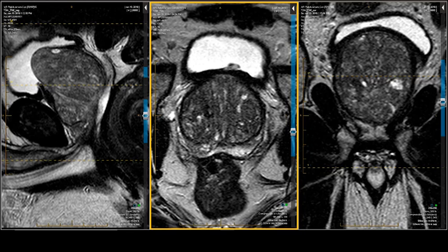Now, the overall gland size is the major criteria that we use on MRI. So 27 cc's, 30 cc's, mildly enlarged, 80 cc's, moderately to markedly enlarged. So we would measure this and apply the constant to it and give you a number. I'm not going to do that right now because that's just a mechanical maneuver. And then things like histology, stromal or epithelial hyperplasia.